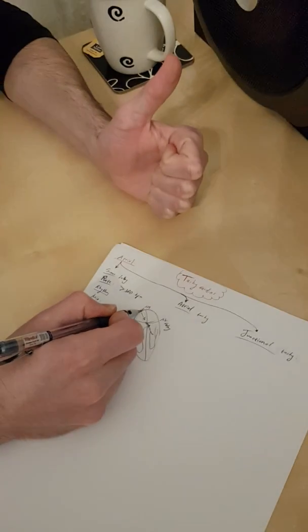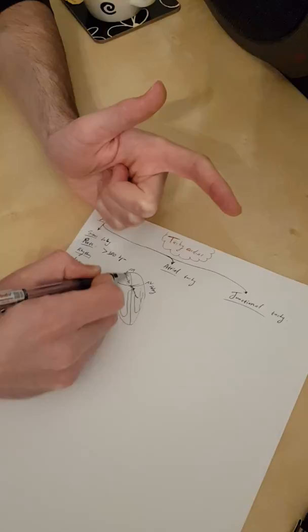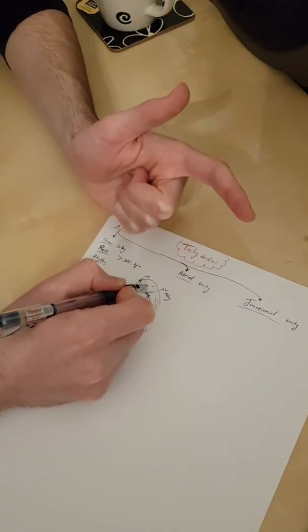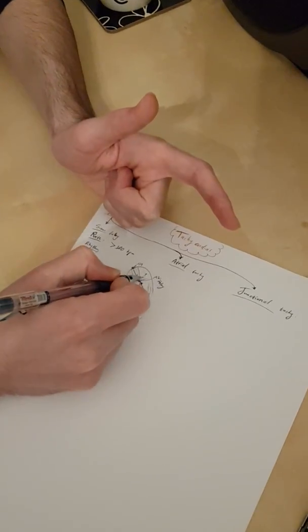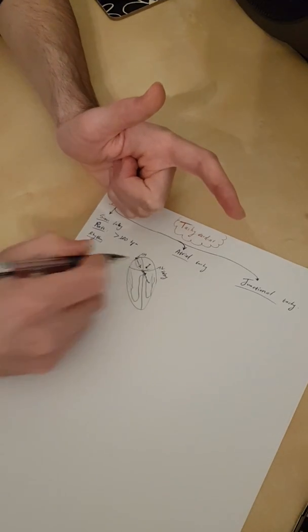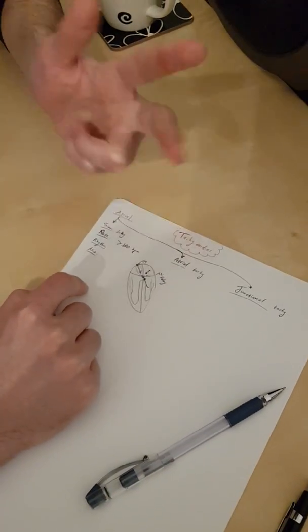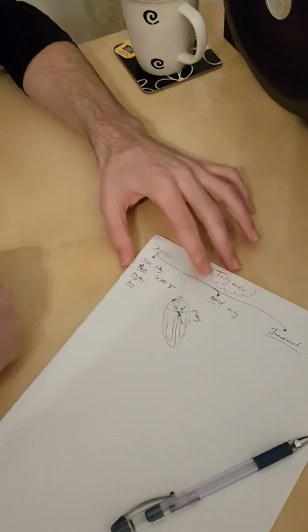That's one condition. The second is that it should be conducted throughout the atria normally, so the P wave morphology should be this way. For example, if it came from here, from an ectopic focus, and it goes this way, then this wouldn't be a sinus rhythm, because the P wave would look different than it would if it had come from here. So that's why the P wave morphology should look normal. And when we say morphology, every wave we analyze in 3 parts: the duration, amplitude, and morphology in general.